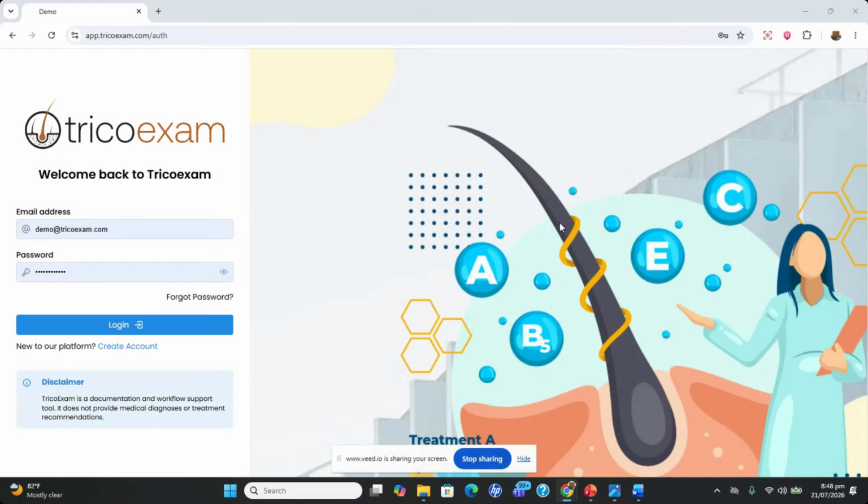This video is going to be on the TricoExam Hair Protect program, and we're going to show you how to navigate through some of its features, as well as how to produce and interpret the results that the report is giving you. The first segment is all going to be how to log in and how to navigate. So let's jump on in.